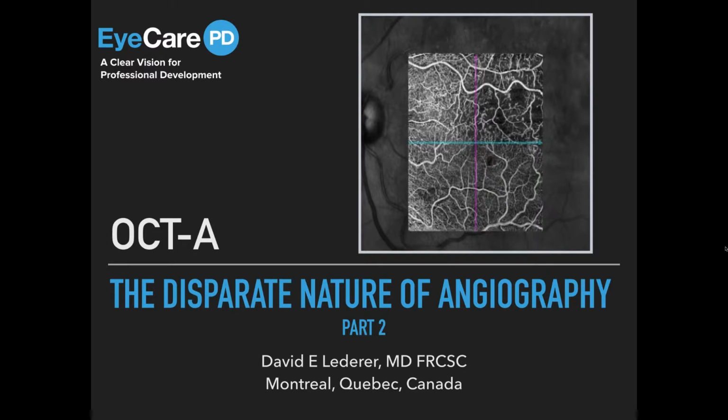OCT-Angiography is our topic today, and this video lecture is a continuation of my previous lecture of the same name. This portion is aimed at deepening your basic understanding of OCT-A image interpretation. And what better place to start in terms of image interpretation than with understanding slab analysis. So let's jump right into it.